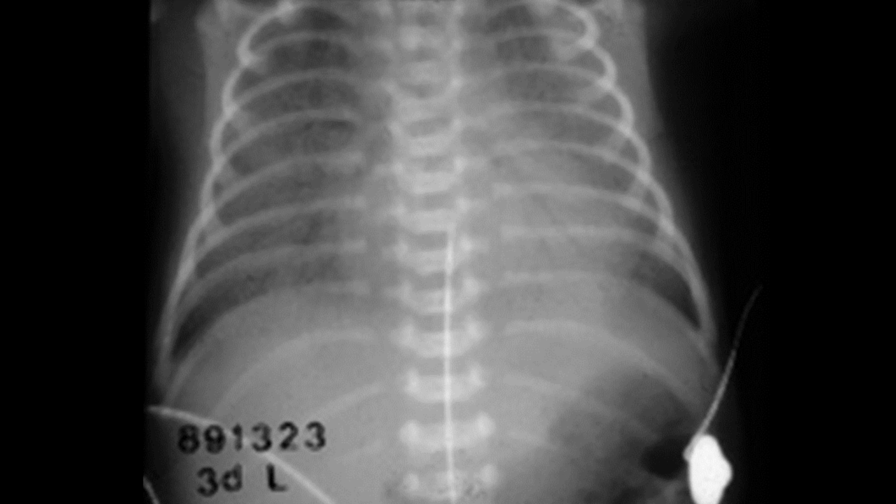These are tubular structures that remain visible because the surrounding alveoli are filled with something other than air, in this case, fluid or collapsed alveoli. The lungs appear smaller than usual, which is another important clue. The reduced lung volume suggests that this baby's lungs are not fully expanded, further hinting at an underlying surfactant deficiency.